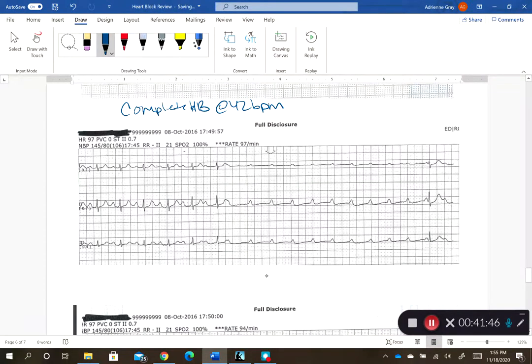All right, this next patient, I have a series of 3 strips. That was actually a patient that I had. This patient came in for a syncopal episode. I believe we're at Cedar Point actually, passed out, had some syncope, and they came in by squad, pretty stable, pink, warm, dry. Good thing that this patient came in. They were fairly young, in their 30s, really stable.